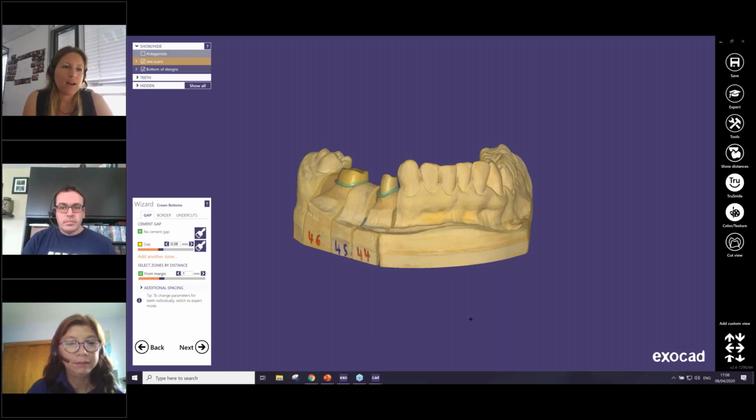If you have an angulated screw channel, there is a possibility to set up a special setting where you can change the shape if it's more edgy or more round. But for this, you have to contact your reseller. They will give you support. Normally we have a default parameter, but it's possible to change it a little bit.